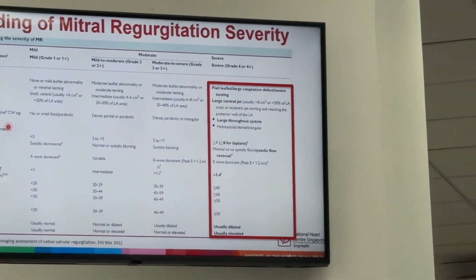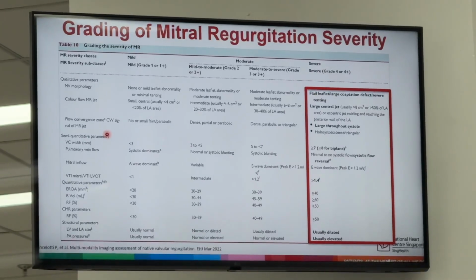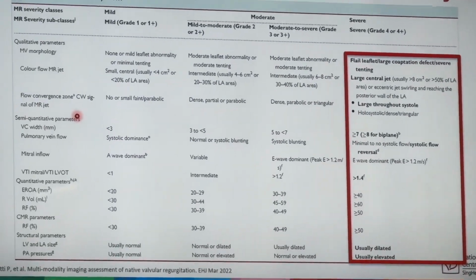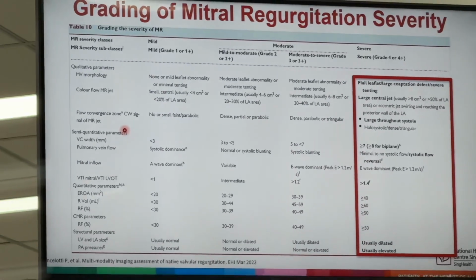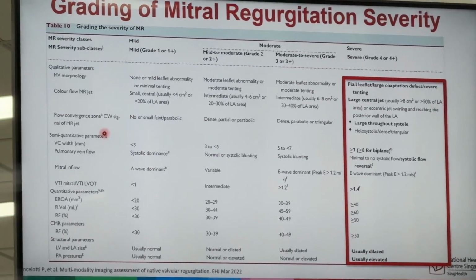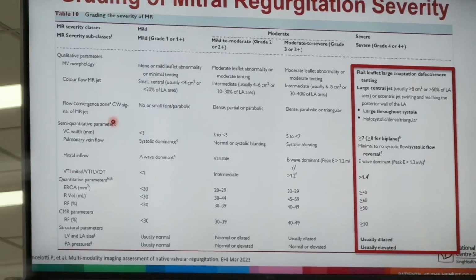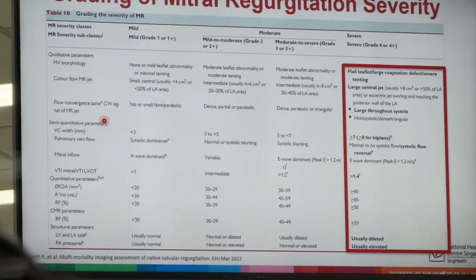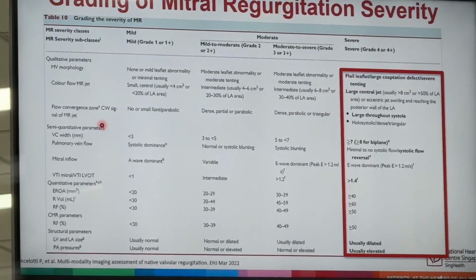I'm sure everyone is very familiar with the classification or the grading criteria for mitral regurgitation. And this is actually especially important in the pediatric population because of different body sizes. So it's not as easy as classification in adult populations. You have to have a look at the body size of the patient, different stages of growth as well. But just very briefly, I think the first thing that we need to look at is actually the morphology of the mitral valve leaflet itself.